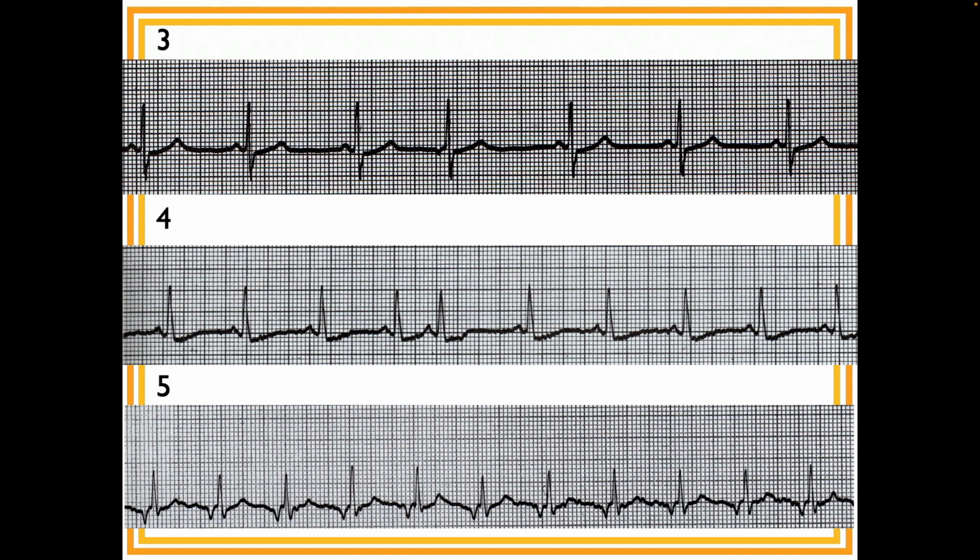And there are P waves present, but they're inverted. I think it's just inverted at this one weird one. Can you point out the feet? I'm sorry, my hands don't stay still. Here you go. Okay, I see it.